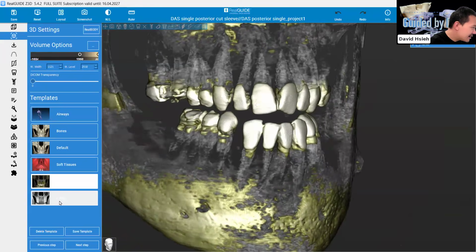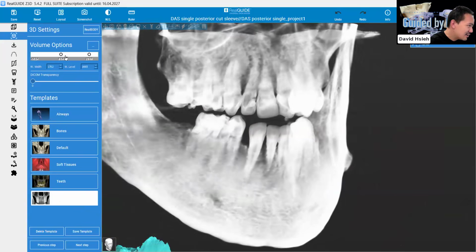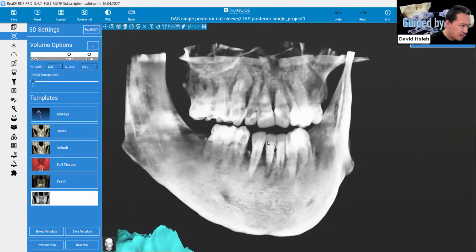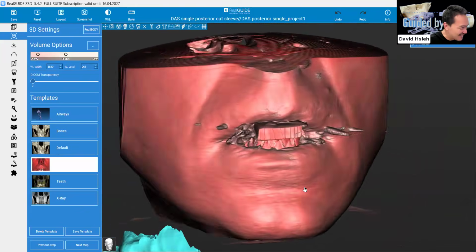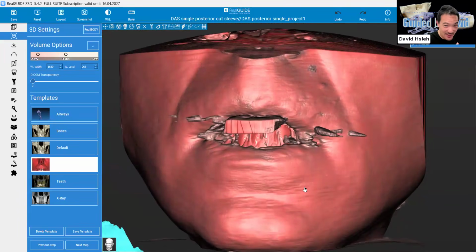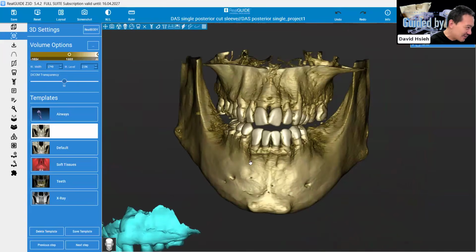And then there's another thing called X-ray. If it's too bright, you just adjust the brightness. Basically, it will call out the 3D X-ray for you. You can see that. Very cool. And then this is my favorite, it can do soft tissue also. Oh my God, how cool is that? So the CT scan can not only show you the bone, it can also show you the soft tissue. Very cool. All right. So if we are all happy with the setting, let's just hit next.